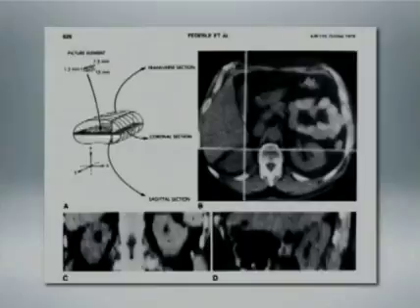It's instructive to look at the parallels between CT and volumetric ultrasound over the years. This is an old article, as you see. It's from AJR, October 1979, by Federley et al., talking about actually not 3D, but more correctly, reformatted CT images. And you can see the acquisition plane on the top, axial, and then on the bottom, you see two orthogonal coronal and sagittal planes. And if you look at those images, you can see the stair-step effect, which shows that the resolution of those images was considerably less than that of the acquisition or axial plane.